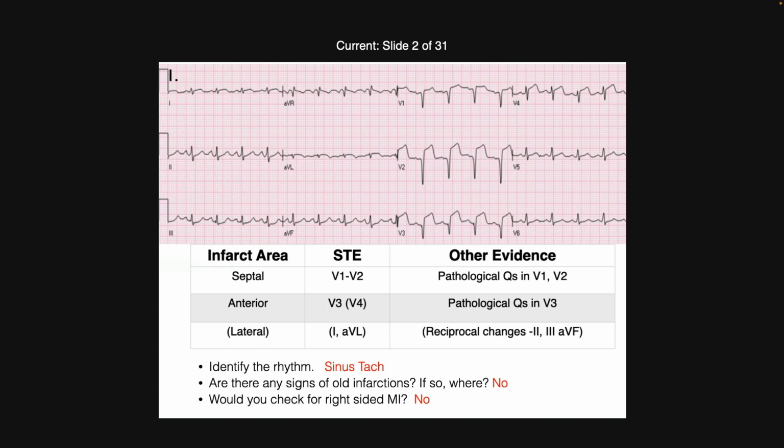First of all, if you don't put it, it's not wrong, right? That's what the parentheses mean, okay? Natalie mentioned there is ST depression in 3, aVF, maybe in 2. So we have depression in the inferior leads, okay? Are those reciprocal changes? Well, let's look at one in aVL.